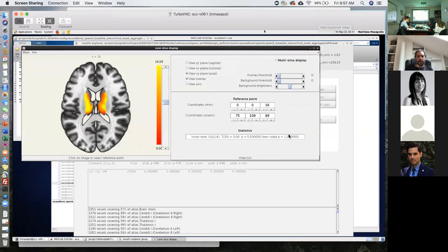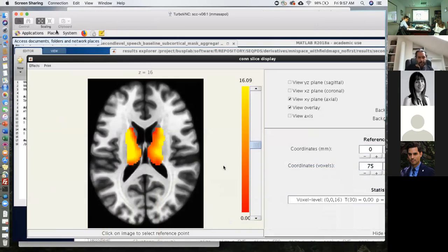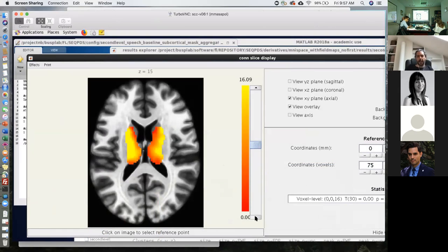In the window that you're showing in the up left, it says effects. And in almost the last one, it says raw data display. This is just to reduce the smoothing that is happening at the borders, basically.